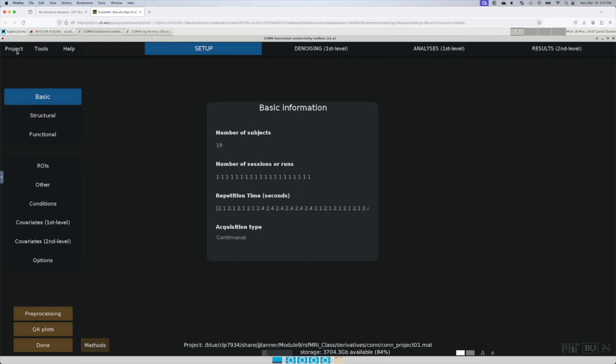And it is still working on this. So this takes a little bit of time. This is a bit of a process. While that's thinking, I'm going to pause this and we'll come back once it'll let me move on to deleting the next person. It has to do a lot of moving data around and sorting this out, so it'll take a little bit of time.